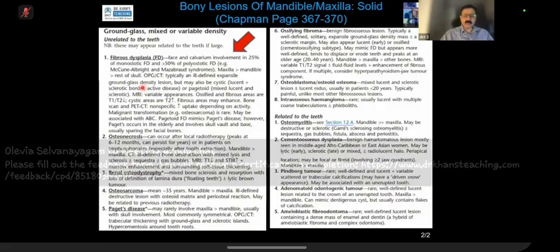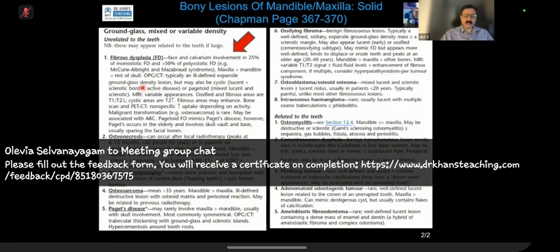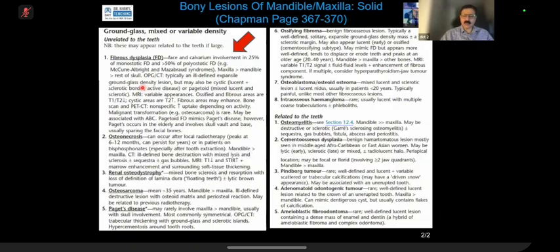With a particular type of ossification, you will get what we call ground glass. But there can be lytic spaces, just like cysts. And then there can be sclerosis because the ossification is more dense, and the rim particularly will get it. So, take home point: ground glass is classical, but it can be lytic. There can be sclerosis also.